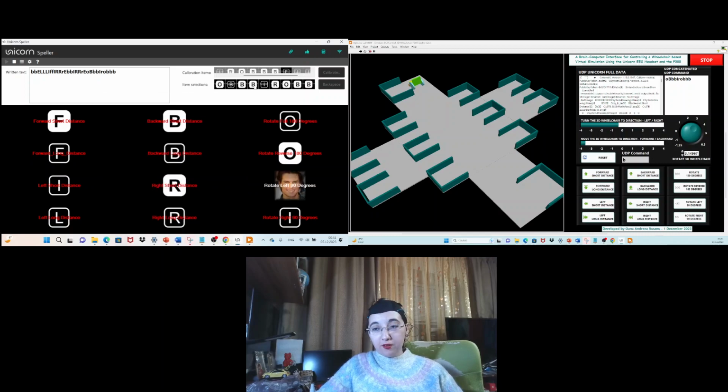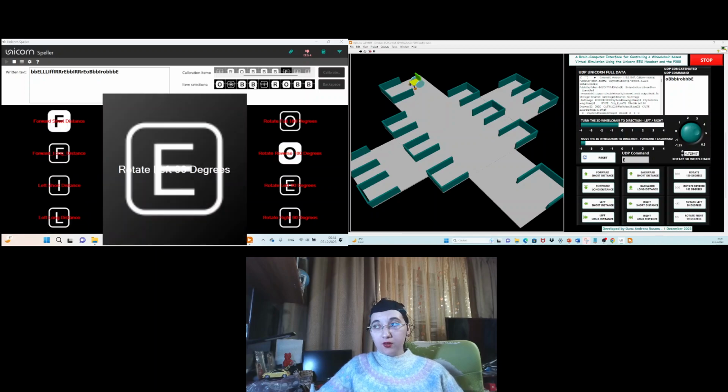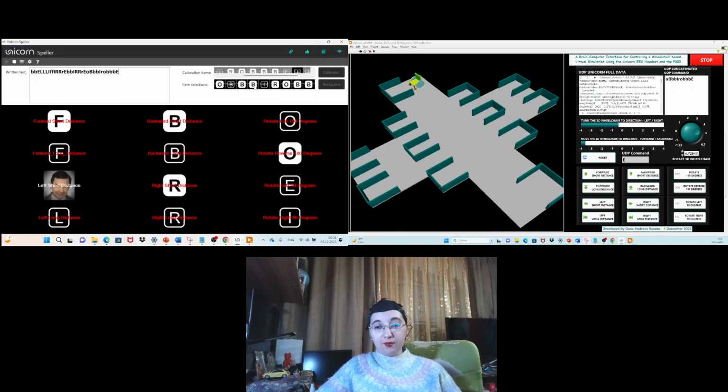Rotate left with 90 degrees, the next command. That's really nice. Then we still have some commands.